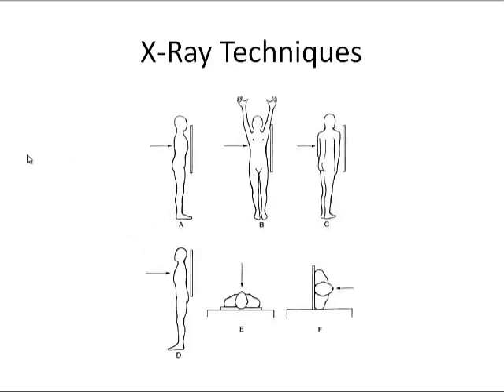So first, let's look at what type of x-ray we actually have. There are two types that we tend to see in the hospital. One is a PA, or posterior anterior back to front chest x-ray, which is usually accompanied by a lateral chest x-ray in which we shoot the film from one side to the other. This is the best quality film because it tends to distort the anatomy of the chest the least.